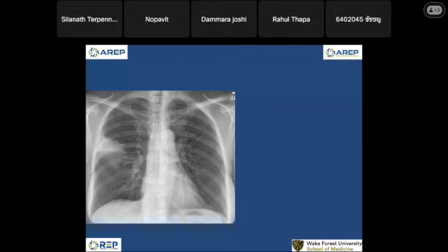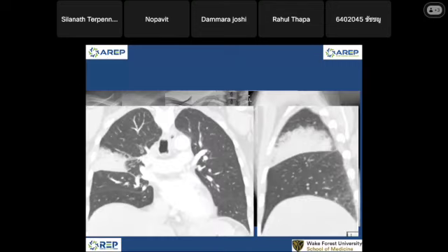So in that case, I would say, go back to the patient and come back for a chest radiograph again. If the chest radiograph is better, I'm not satisfied. He has to come back until it's gone. And if after the treatment the symptoms are getting better, but the chest radiograph still looks really bad or even worse, I will ask to do CT. See, our decision and recommendation is based on the clinical context. Always different age group, different management, and different recommendation. Okay, this is the right upper lobe lobar pneumonia.